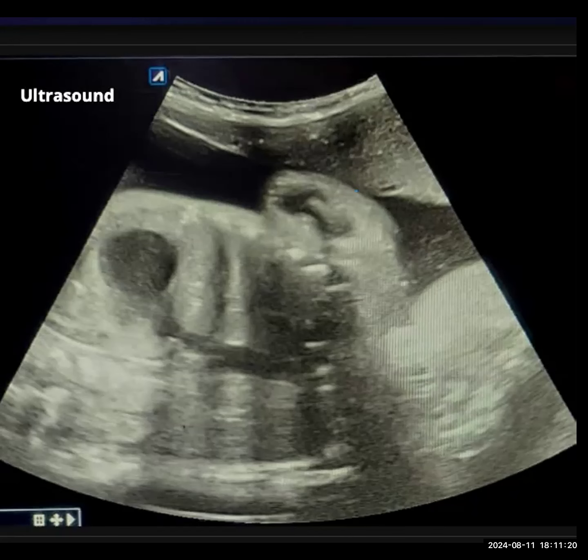Okay, go ahead. So I think this is the diaphragm. Can you see my screen? Yeah, I can. So what do you think that structure below it is? It could be the kidney with a hydronephrotic pelvis. Do you think any other structure can come between the kidney and diaphragm at that level? It could also be the adrenals, so in the suprarenal region, with this being an adrenal hematoma.